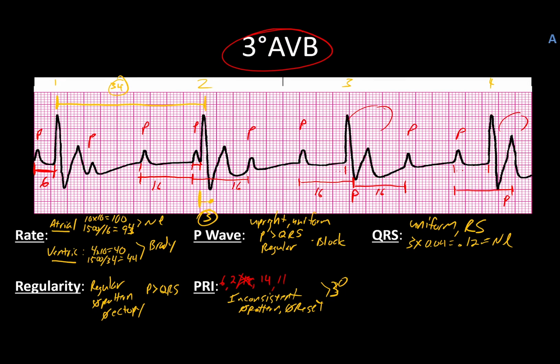Again, a strip from the basic arrhythmia section with all the markings done to look at and figure out what the escape rhythm is in this scenario. We know a few things. We know that we are bradycardic with a rate in the 40s. We're completely certain that it's third-degree block. And what we have is almost a borderline QRS, the fact that it's right at 0.12.